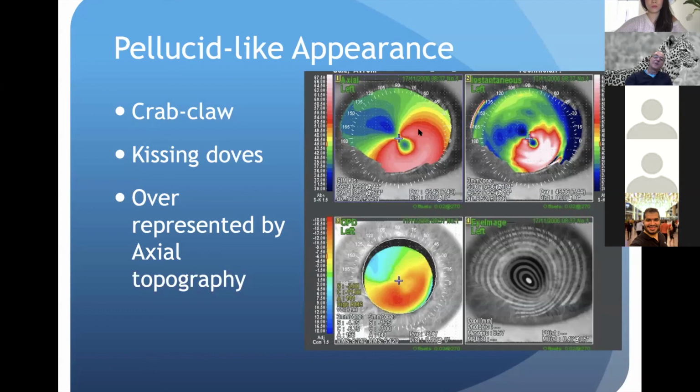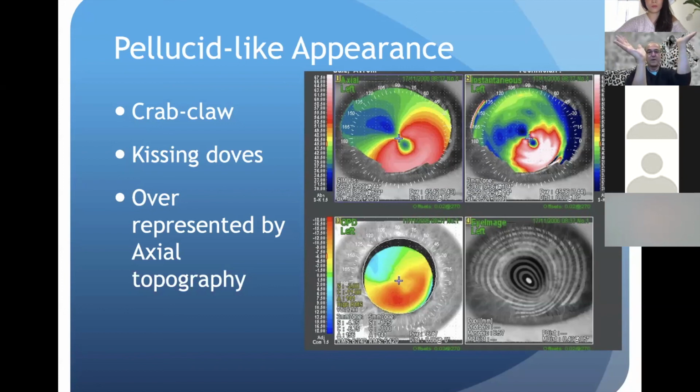The thing you've got to watch out for is the axis of the bow tie. Here, you can see it's at a diagonal axis. And we know that when you look at a patient with keratoconus, their axes are usually like this: the left eye is at 45 and the right eye is at 135.